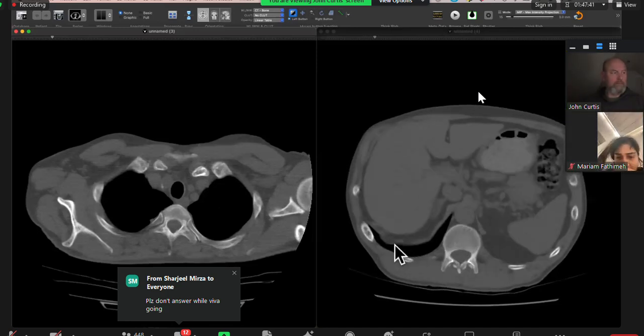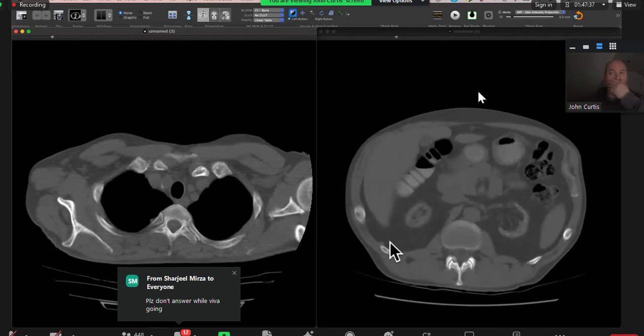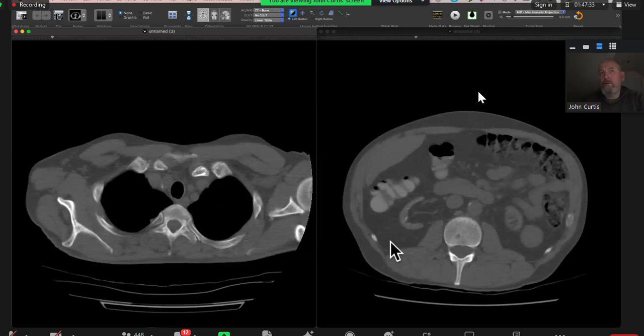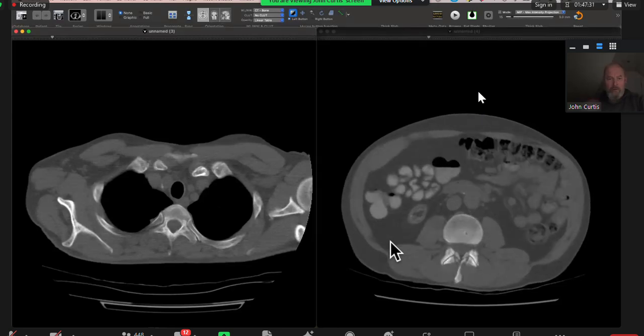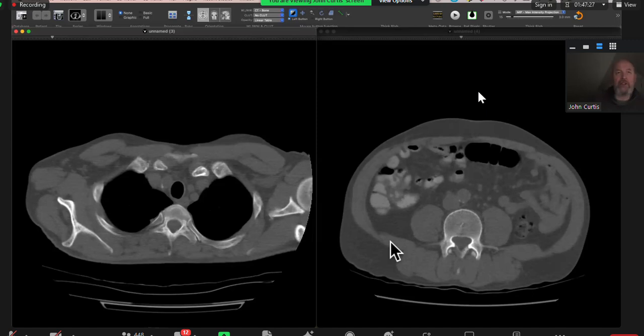So it is most likely a case of secondary hyperparathyroidism, secondary to renal osteodystrophy, with brown tumors in the bones. Yeah. And what operation do you think the patient's had in the neck?